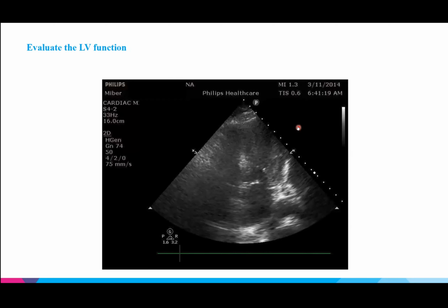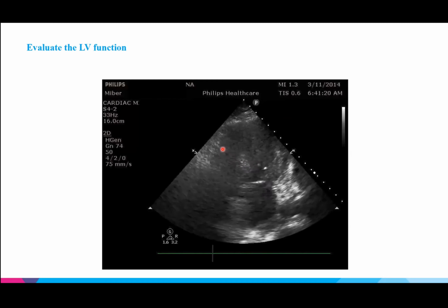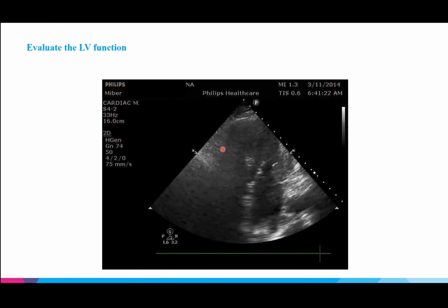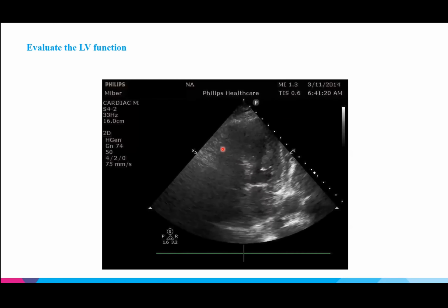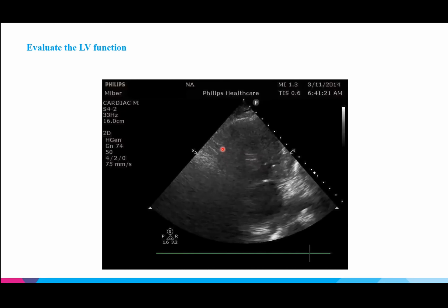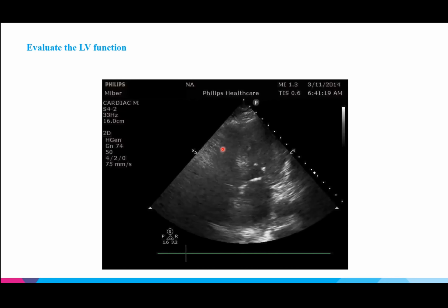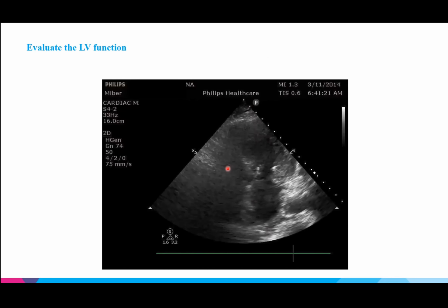All right, so we're saying 93% hyperdynamic, excellent, and then there's maybe a couple for normal and reduced. So very good. And then what is the view here? So I see Arpon saying apical 4, Sherrell's apical 4. Excellent. Yeah, I would say it's not the best apical 4.